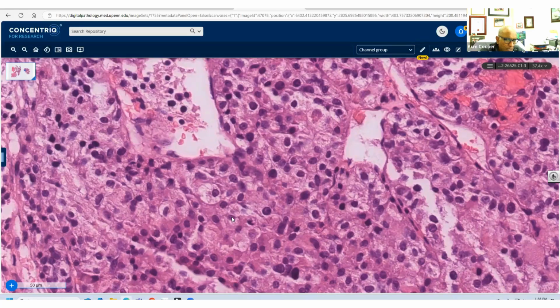So this, in fact, is an alveolar soft part sarcoma that metastasized to the sphenoid sinus in this very unfortunate 28-year-old woman. And like Maria, you heard, the differential diagnosis of pituitary tumors, metastatic renal cell carcinoma, and then PEComa and alveolar soft part sarcoma.